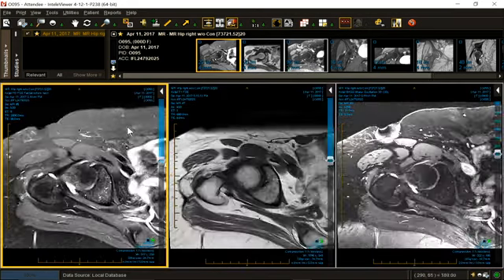And these produce groin pain, and our groin pain was commensurate with a labral tear. She also has excessive loss of hyaline cartilage. It's almost bone on bone. So the entire diagnosis, labral tear, bone penetration, abrasion, erosion, cysts, loss of cartilage, is virtually made on the sagittal projection alone. Let's keep going, shall we?